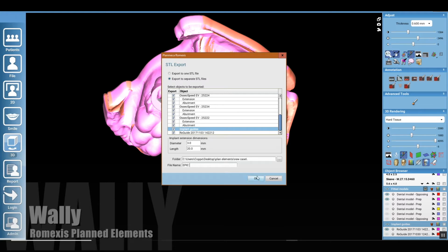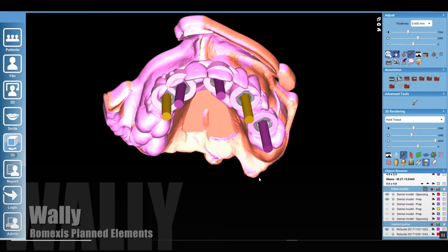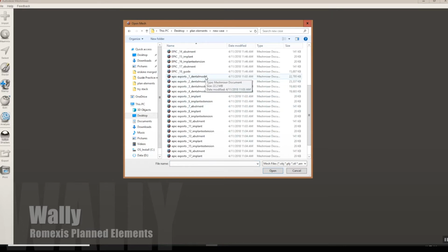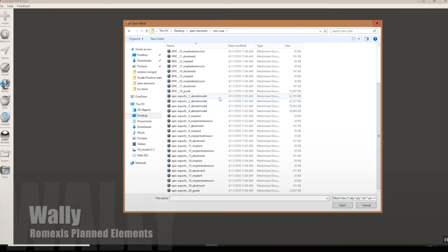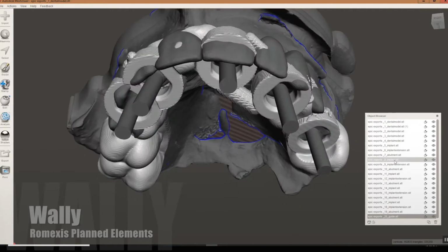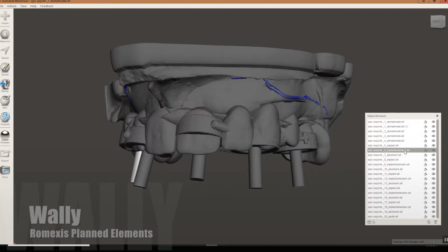And then you just hit OK, and it will dump all that stuff, pretty much everything, including jaw segmentations, tooth roots, everything that you basically have. You could export like 5 jillion things. Now, so what do you do with this? You could bring it into PlanCAD Premium. You could bring it into Mesh Mixer, PlanCAD Easy.